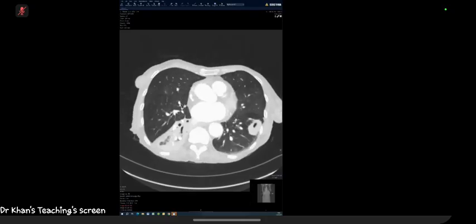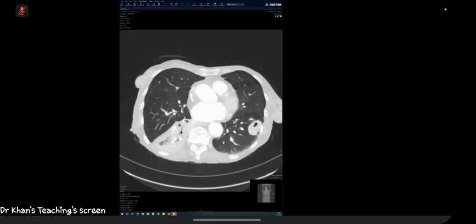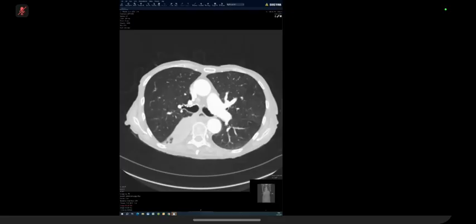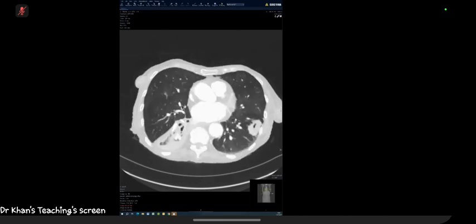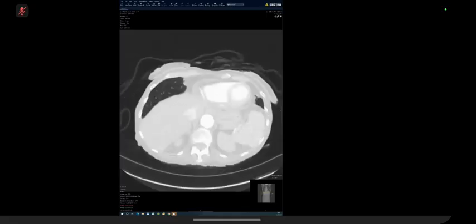And what would be the next step? So in this situation, I would alert the oncology team and refer for a radio oncology MDT. Okay. And anything else you want to do, imaging-wise? We've only covered the chest, so you would want to do an abdomen. Yeah. Okay. So we'll park this case here. I'll give you a couple more, and at the end of your half an hour, we'll go through the cases one by one. Is that okay? Yeah, that's fine. Okay. So let's go to the next one.